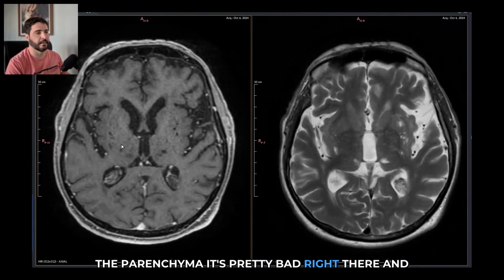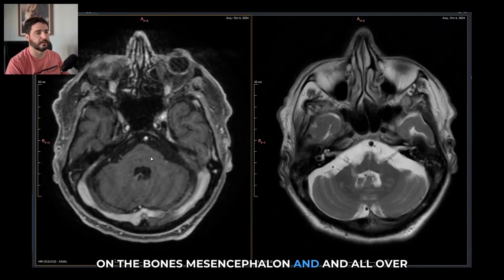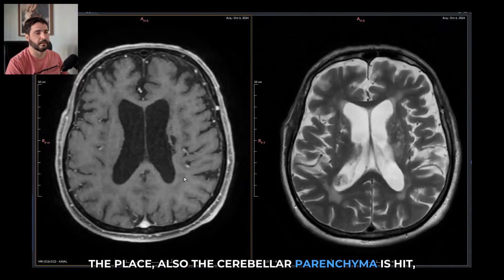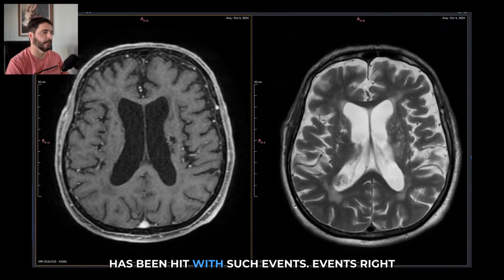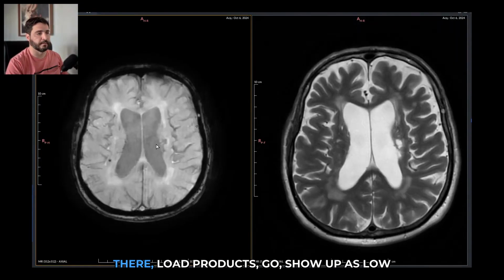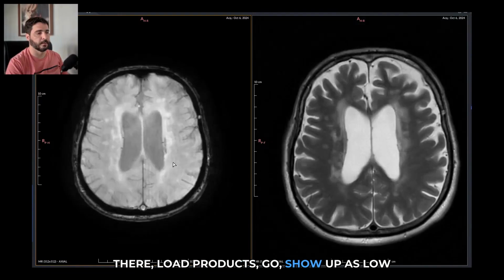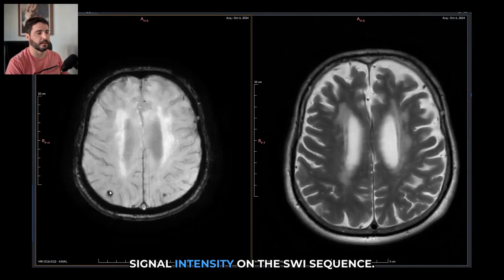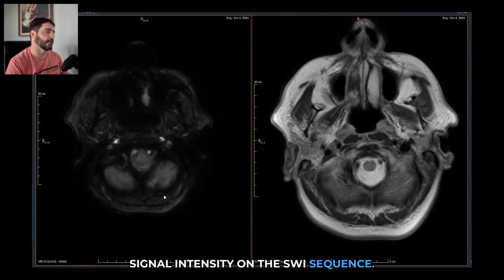It's pretty bad right there, and on the pons, mesencephalon, and all over the place. Also the cerebellar parenchyma has been hit with such events right there. Blood products show up as low signal intensity on the SWI sequence.